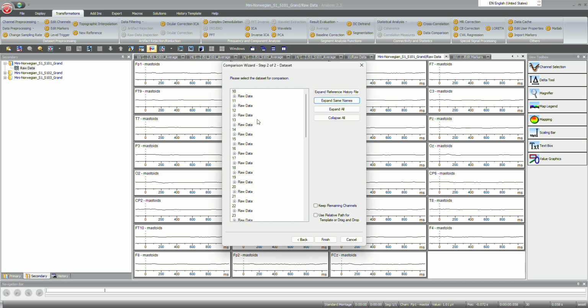Right, now here you can see that this is the raw data. Each of these are participants. If we scroll down, we can see what we want, which are the grand averages. We want to select this one, which is our gender agreement violation.